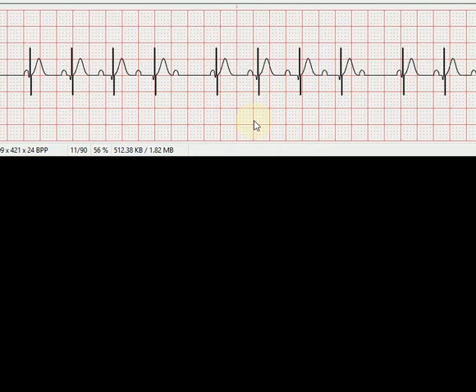If it's me, I would rather try and keep the name as normal as possible, so I just call this a sinus rhythm with Wenckebach, or sinus rhythm with second degree type 1 AV block.